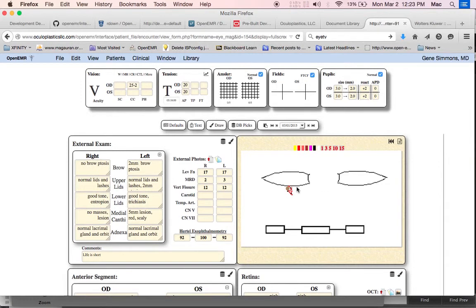Every time you add something and drop an extra image, it's sent to the server and stored sequentially. So ultimately, you'll be able to go back through and do an undo feature, so you can undo any errors you may have made on your drawing. Each of those undos needs to be erased, and the final image, which this is, for this patient, would then be the only image that's saved in the database.